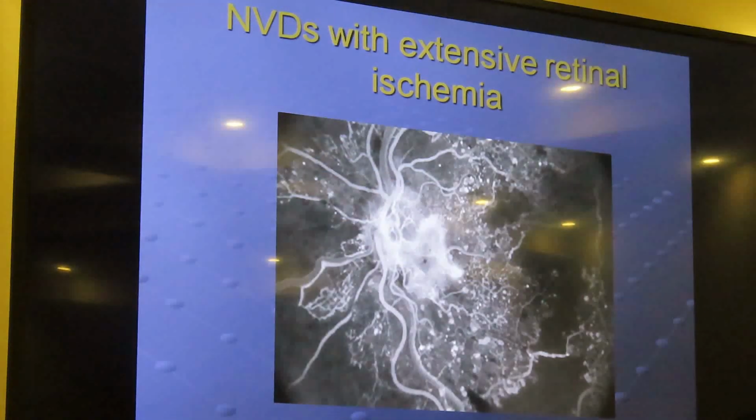About the macular edema and the ischemia, you can see how large the ischemic areas are. Please concentrate on this because when we discuss OCT angio, we will see these areas, because this is a magnified picture of fluorescein angiography, which looks like OCT angio.